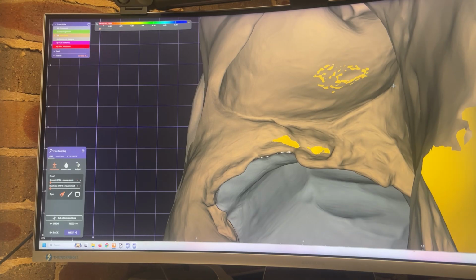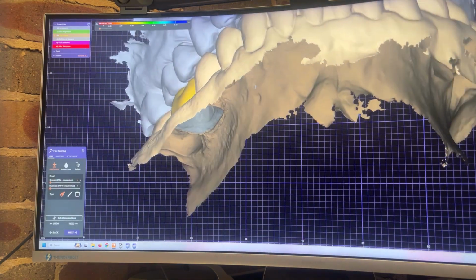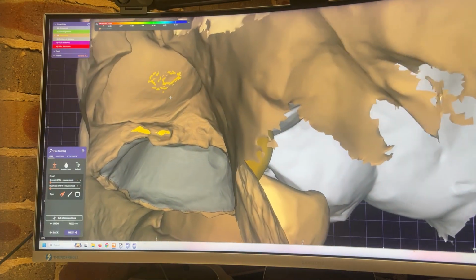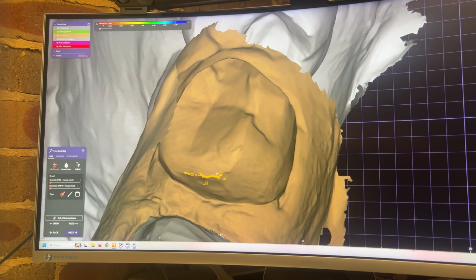Remember, we still have to add glaze. So with your case, Steve's case, Julian's, I'll add glaze all over it. It adds about 0.1 mil everywhere, the stain as well. And then on the contacts, I'll polish off the glaze. So in theory it should be back to how I set it here.